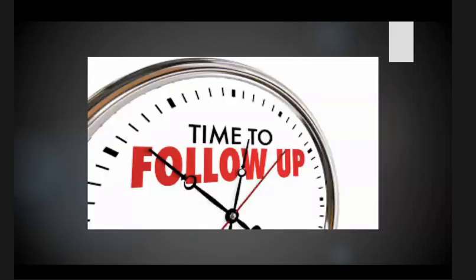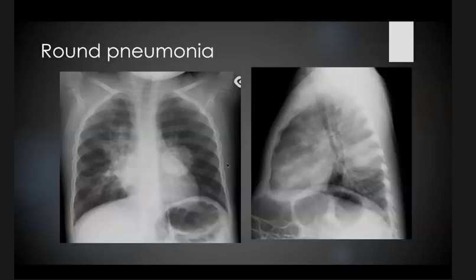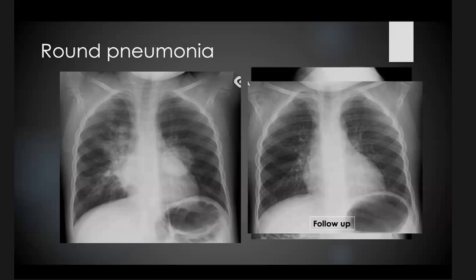So, time to follow up. Who do we follow up? Most of the time, kids get better from regular community-acquired pneumonia with no complications. You don't need any follow-up. So we don't recommend follow-ups for regular pneumonias, but who do you need to tell the doctor to follow up? The rounded pneumonias, as I told you earlier, are round. It's a transient aspect of a pneumonia in time. So if you follow it quite quickly, a week or two later, it won't be round anymore, and you'll be able to see that it's not a mass. That kid on the follow-up was completely normal.